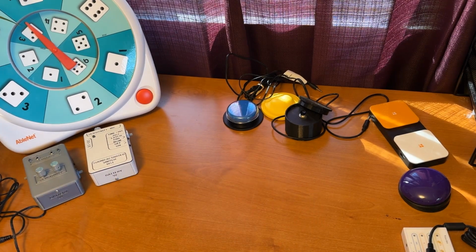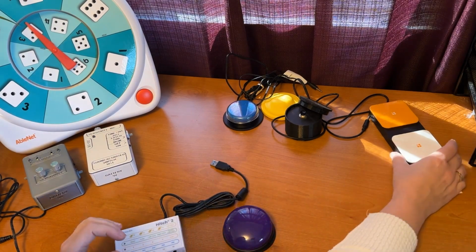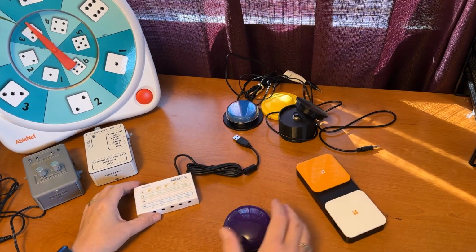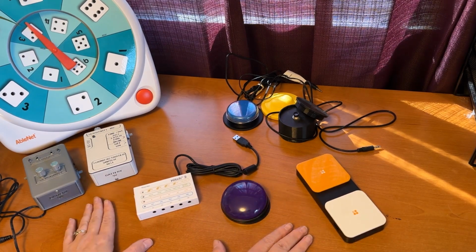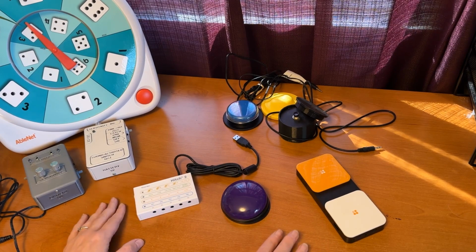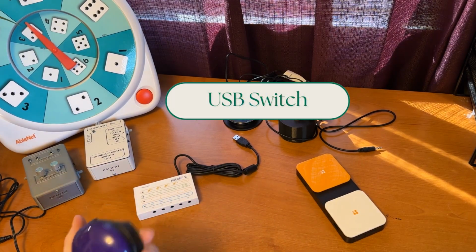Along with those, we do have some various ways to control an iPad, a tablet, or a computer. And these are some of the devices that can help with that. Again, there are a variety of different brands and styles of these. I just have a few examples here. This one is a Praetorian USB switch.